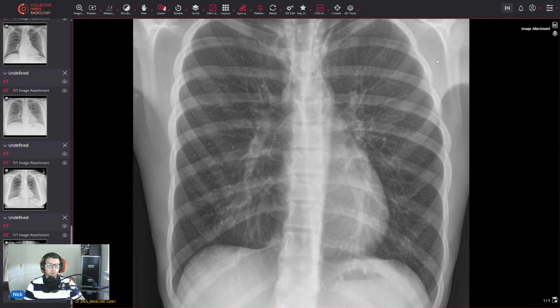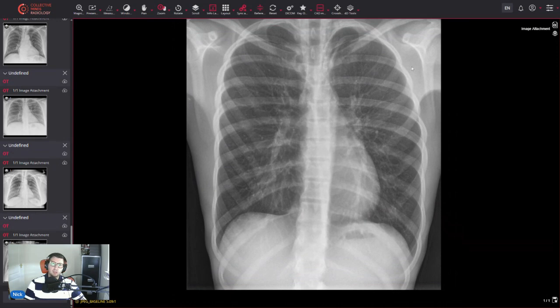So this is a patient with pectus excavatum. This is a condition where the anterior part of the chest curves inwards. And the classic signs are that vertical orientation of the ribs where it's starting to curve in, and losing that right heart border due to the anatomy.